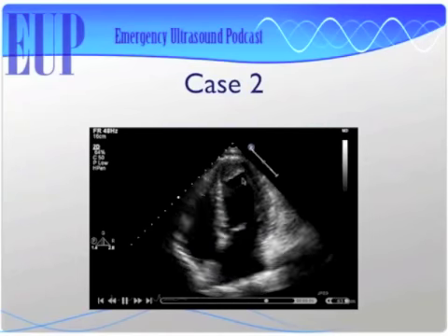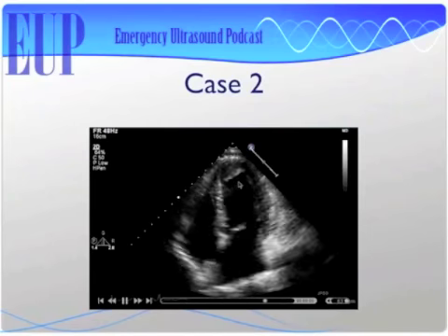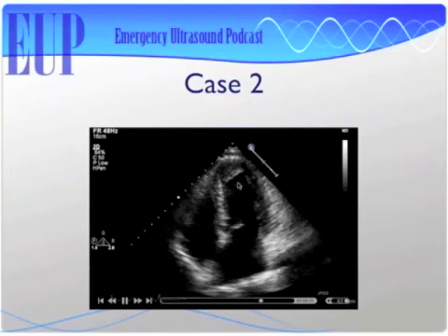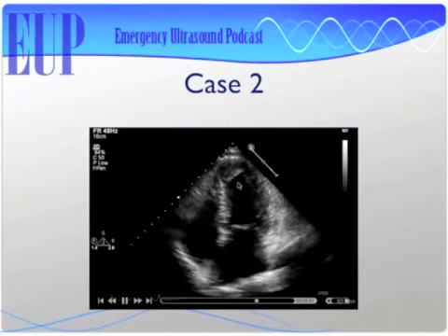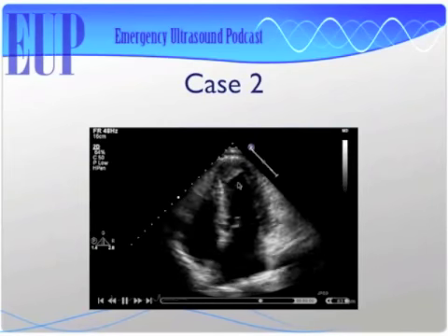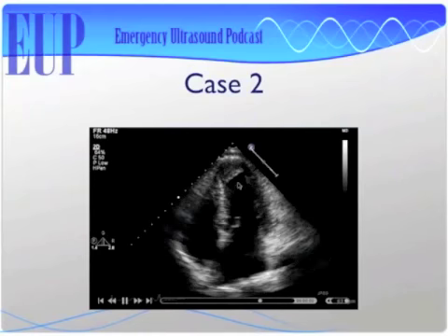What's that funkiness up in there? I'd say maybe a clot. Yeah, so that's a funky clot chilling out in the LAD distribution. So what happens is when you get that part of your heart that's so dead, or the myocardium has been down for so long that there's not any squeeze, you actually get hardly any blood flow in that particular area, and the blood will just sit there and it'll clot off, and that's how people get apical thrombi. It's very, very rare to get an apical thrombus without some sort of coronary artery lesion.